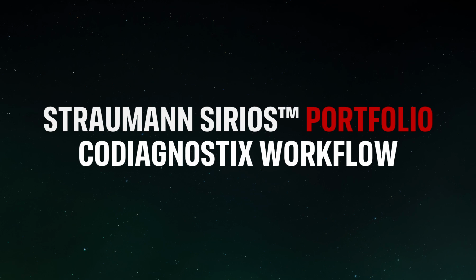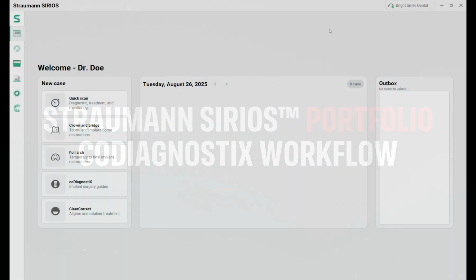Straumann SIRIOS Portfolio, coDiagnostiX workflow.